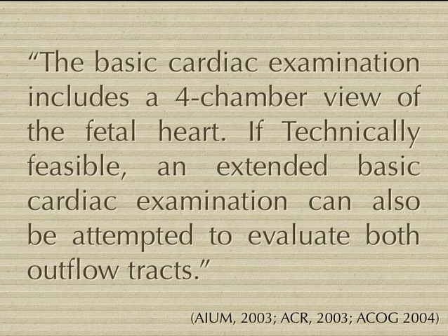This statement is listed under the section Fetal Anatomic Survey. Prior to the introduction of the current ultrasound recommendations for the antepartum evaluation of the fetus, the only recommendation regarding the fetal heart was that the four-chamber view should be examined. There was no mention of the outflow tracts of the fetal heart. Currently, however, the following is a statement regarding examination of the fetal heart.